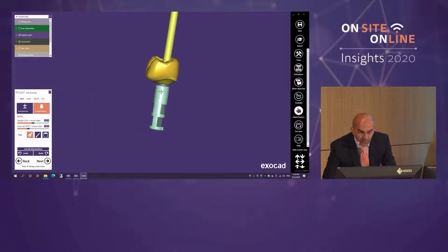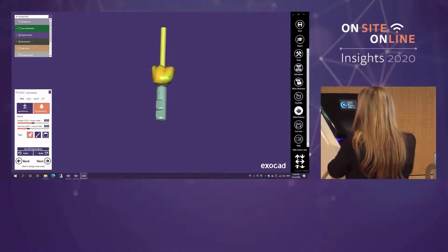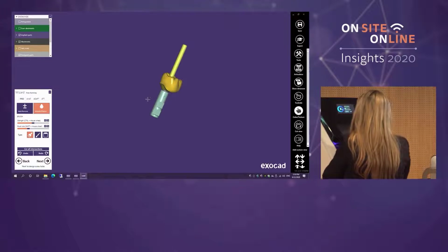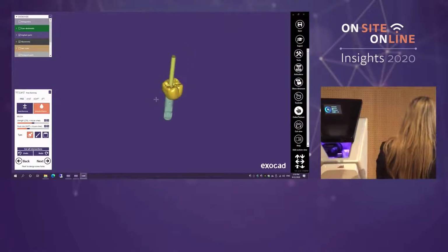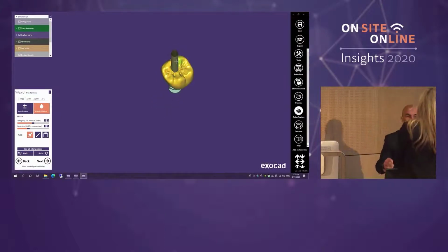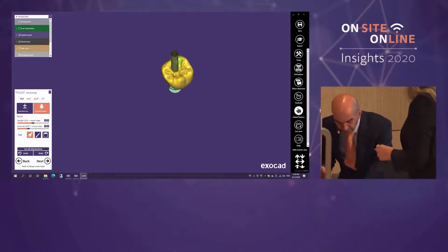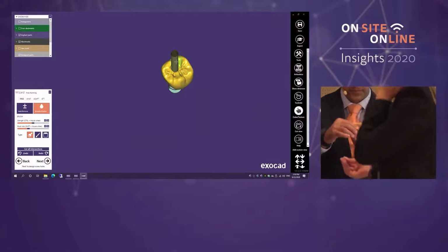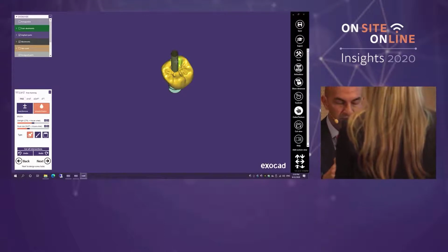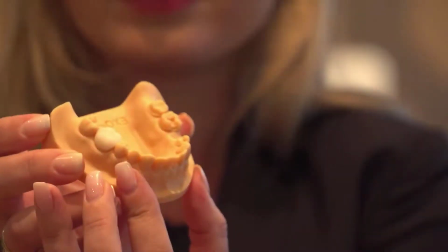Christine, would you do the honors and just take that crown out for me, please? It's a brand new machine, Christine. You have to pull hard. Thanks to Nicholas and Sven for providing the machine, by the way. They're from VHF. That's okay. Lovely. Well, Christine, how about you show this to the camera and show our audience at home and in the room how that fits, and give them your honest opinion, please.